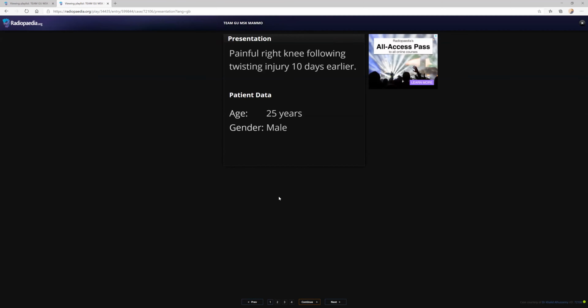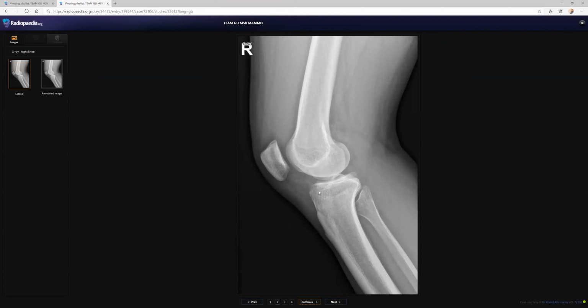So this is a 25-year-old with knee injury. You have to ask for an orthogonal view. You asked, but there was no orthogonal view. And you correctly pointed out the lateral femoral notch sign here. And there is a knee joint effusion that you have missed. So you have to mention the knee joint effusion also. And you have to alert the referring clinician about an internal derangement of the knee, especially any ligament injury.